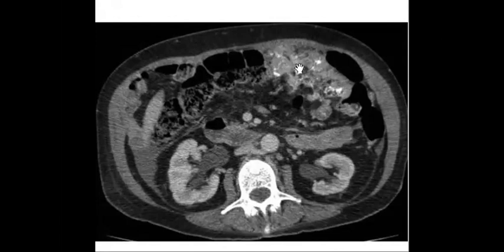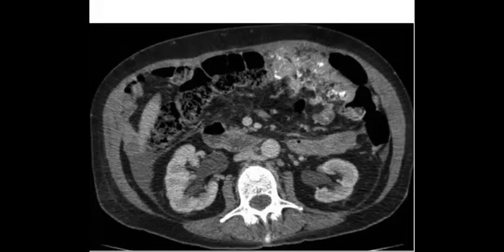So this is what's called omental cakes, peritoneal deposits, peritoneal carcinomatosis. You should describe it as peritoneal and omental calcified lesions. So it is omental cakes. So omental cakes, bilateral ovarian masses, and what else are you still missing? If you miss like this, you lose some marks. So take care.